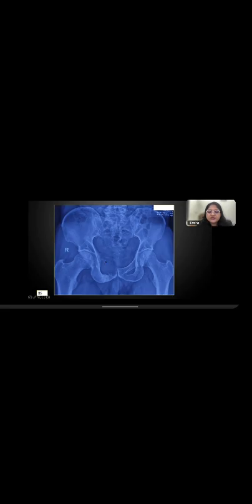So in this patient, it was a plasmacytoma that was causing pain and soft tissue swelling on the right side of the pubic bone. And it was a very aggressive and malignant lesion. So this is a very important finding to be picked up. Sometimes we see what is there, but what is not there also has to be picked up.